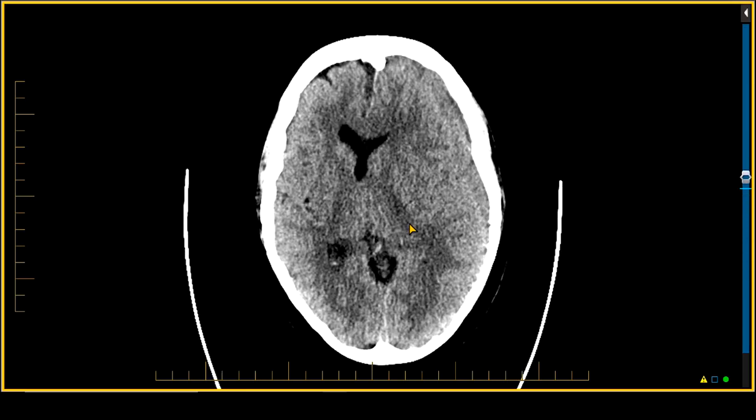Now, this patient may have lost consciousness days ago and been found subsequently, and therefore we could identify this as a subacute in age isodense subdural, or we would check the hematocrit, see whether the patient's anemic, in which case it would be potentially an acute isodense subdural hematoma. No matter what, if we were to measure this, we would find that the collection is 13 millimeters thick, exceeding the 10 millimeters thick criteria for surgical intervention, and that, as well as the 7 millimeters of midline shift, would lead the neurosurgeons to intervene in this patient.